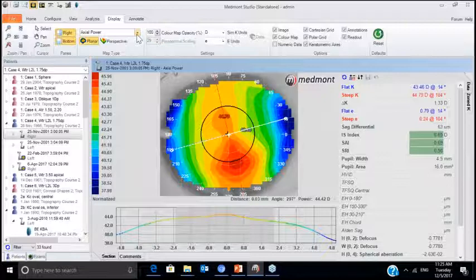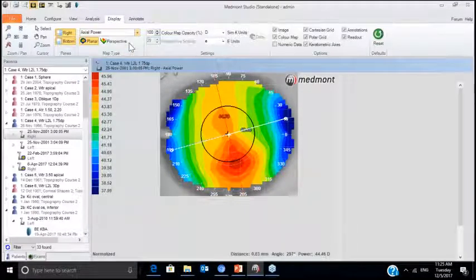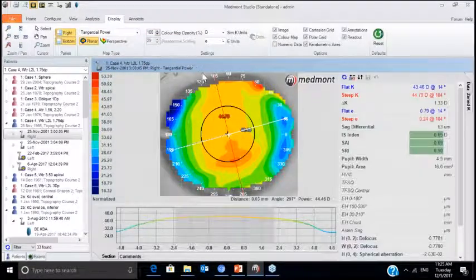We have all of these different analysis options. And what I might recommend, and Nikki would probably agree with me, is that axial is one of the best ways to begin. Because what axial does is it explains to us how the cornea would contribute to vision. And as you know, about 80% of the quality of our acuity is derived from the cornea, and most powerfully, the anterior surface radii, or shape of the front of the eye.